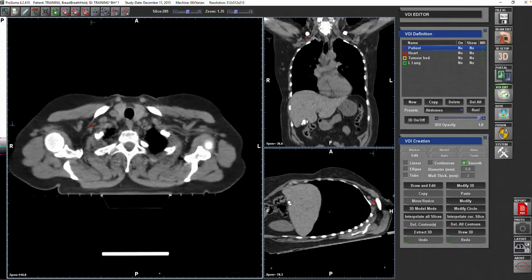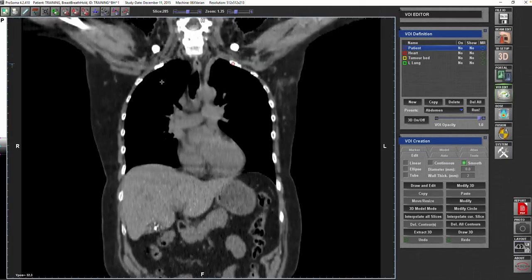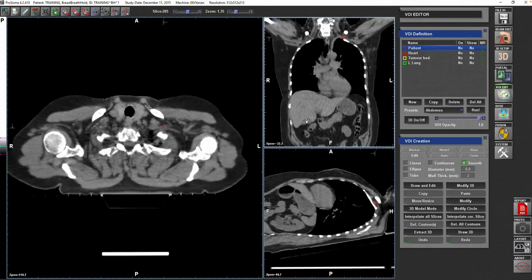One is just above the arch, on the left side if you see it on the left side. But again, from the coronal view, you can easily see the artery crossing a line between the first rib and the clavicle, and at this point you will start your level 3 group of lymph nodes.